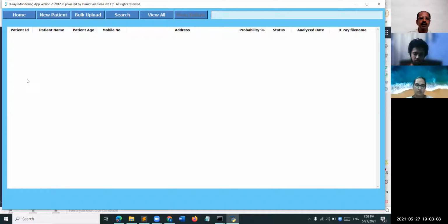on the screen. This is an artificial intelligence tool we would like to deploy to hospitals, clinics, doctors and radiologists who would like to do a first cut review using this tool so that it saves their valuable time. Now I will show the demo of the application.